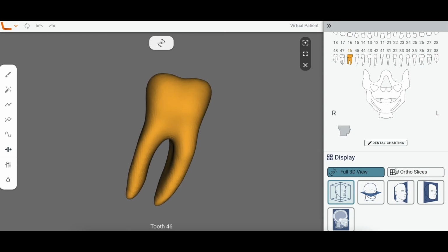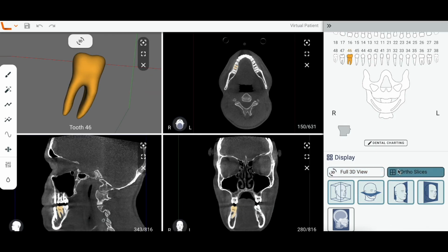Finally, when selecting a slice and a structure at the same time, it allows you to select any of the different tools that are possible to change the segmentation. We will go into more detail in one of the upcoming videos.